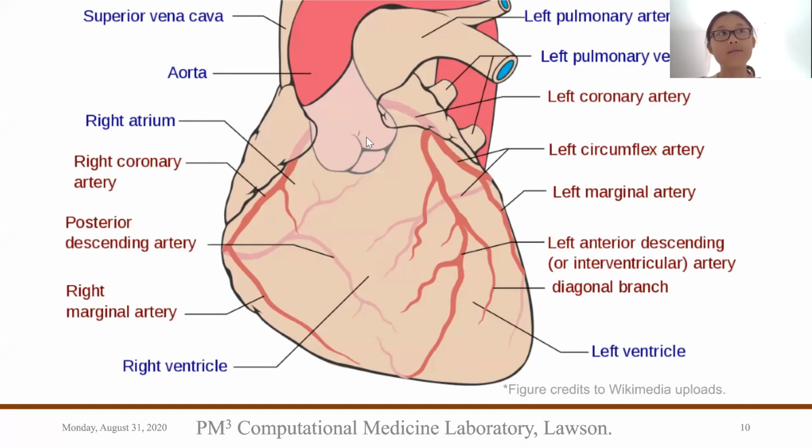In many of the SimVascular coronary modeling data image sets, or specifically the image sets that we might have access to, the aorta will always be fairly easy to identify since it's a large vessel. But off of the aorta, we have the coronary arteries. What the coronary arteries are responsible for is delivering oxygenated blood to the heart muscles. The two main coronary arteries are the left coronary artery and the right coronary artery.